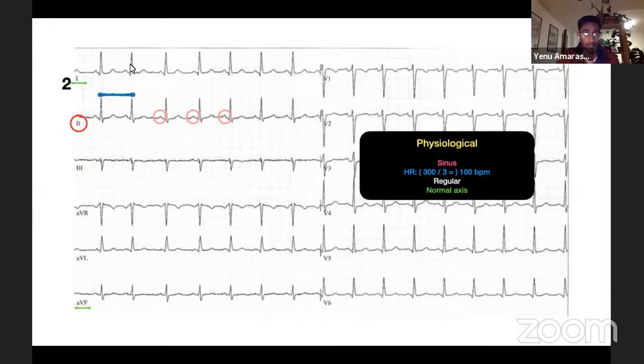So it's very clear that lead 1 has a very positive deflection. So that's in the direction of lead 1. And then AVF might be very difficult to tell, but I think there's a slight overall deflection, which is positive. So if you nullify or cancel out the negative deflection, there's a very slight positive deflection.